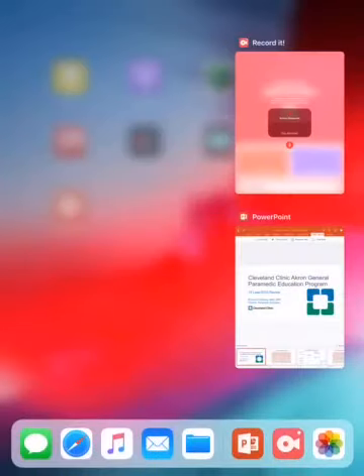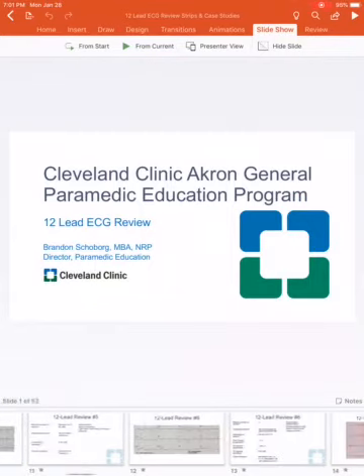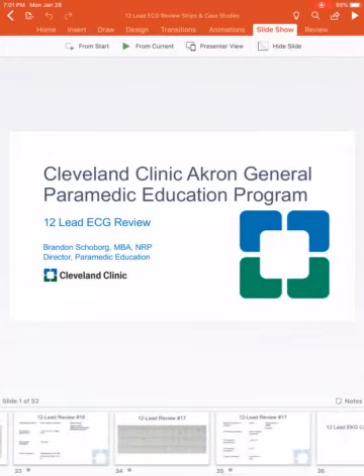All right, so we are going to go ahead and dive into the 12-lead EKG review assignment that I have posted on the Google Drive for you all to bring to class with you tonight. I believe there's 17. Yeah, there's 17 12 leads that we will look at.